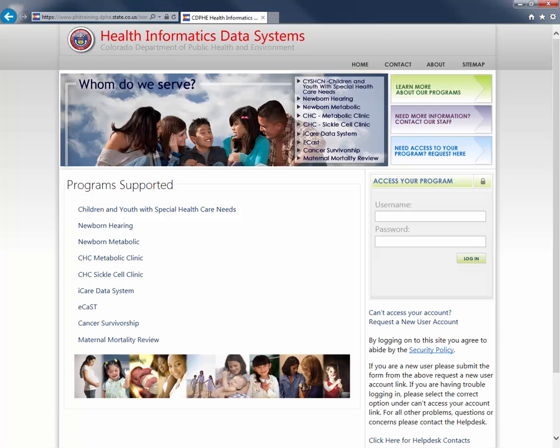To summarize our hearing screening module number 2 video key points, please verify the birth certificate information that you'll be keying, such as date of birth, spelling of last name, spelling of first name, before searching for your baby. Secondly, you can create the baby's record, even though the baby is not found, through our Add New function, directly linked off our search results window. And lastly, when the baby and mother's records exist, you may key the hearing screening results as discussed in hearing screening module number 1. This concludes our hearing screening module number 2.